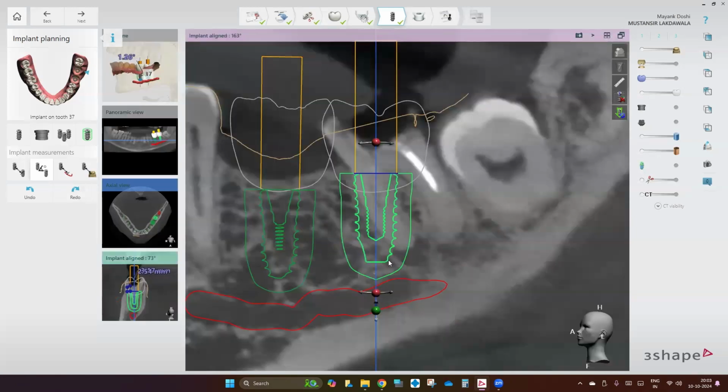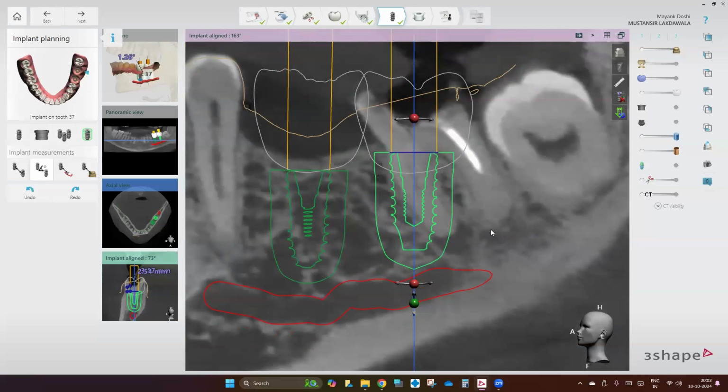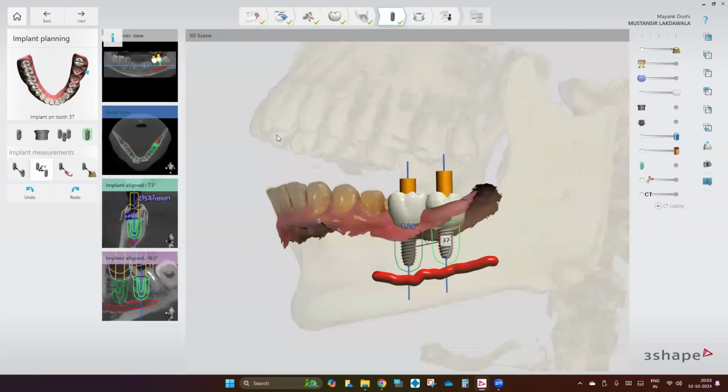So now if you notice, can you appreciate now, this is my periapical and my implant is fully outside my periapical, coincidentally. So this is another philosophy of thinking that अगर फ्यूचर में ये भाई साहब थोड़े और नजदीक आ जाते हैं, तो आई डोंट वांट टू प्लेस माय इम्प्लांट सो क्लोज टू दिस मोलर, दैट it will make two things very, very difficult for me.